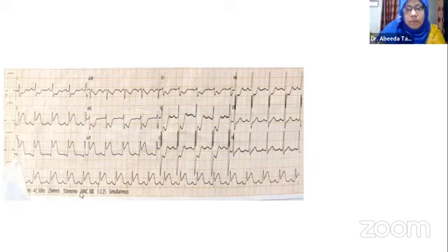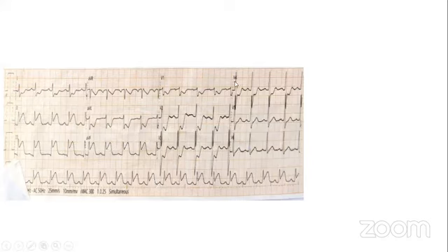Okay, Madhu sir, your comment please. Whenever we are reading an ECG, I would always stick to the first basic thing, the rate and rhythm first, and then I'll go on to tell about the other things. Naim is very good in his observation. And I always tell my students, do not look at only the obvious thing. First look at it, then go for the secondary changes. He has described nicely the ST elevation, then the ST depression, then the anterior chest lead changes. This is very nice of him.